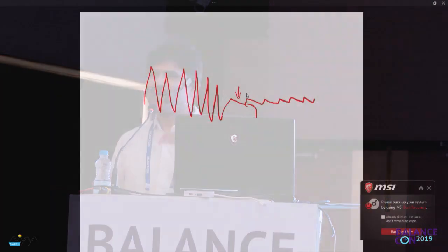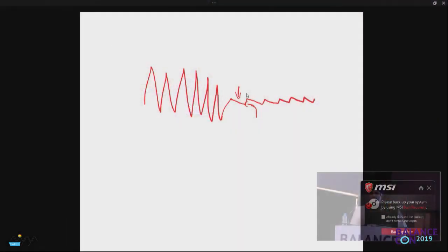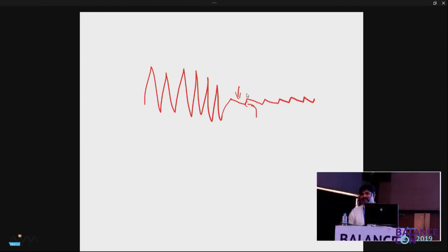Next you see the first example that we took. Direction fixed nystagmus. Can you see? There is a right gaze, there is a left gaze. On the right gaze also, the eye is beating to left. On the left gaze also, left. Is that right? Who all can identify? Who could not identify? Please tell me. Direction fixed nystagmus. Please raise your hands. 1, 2, 3. Fine.